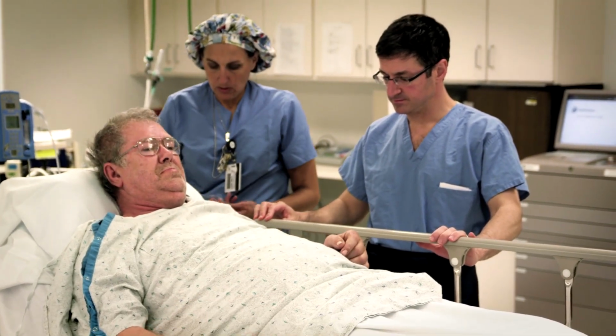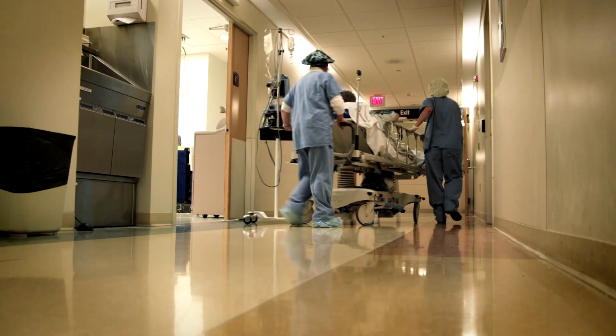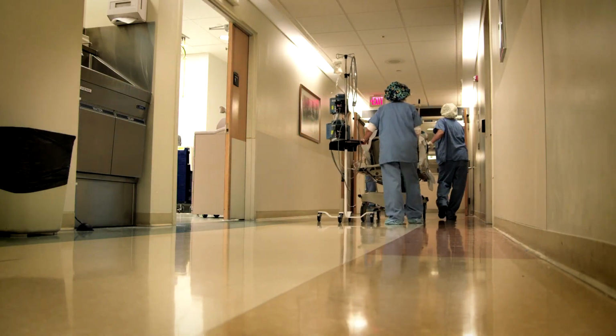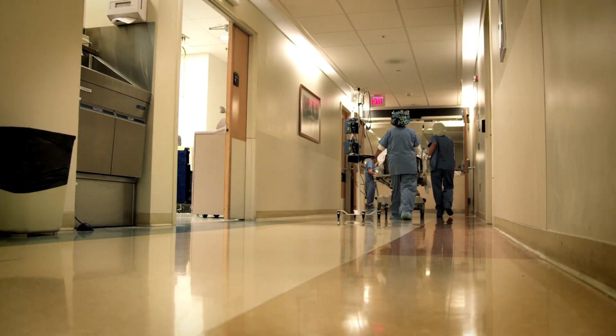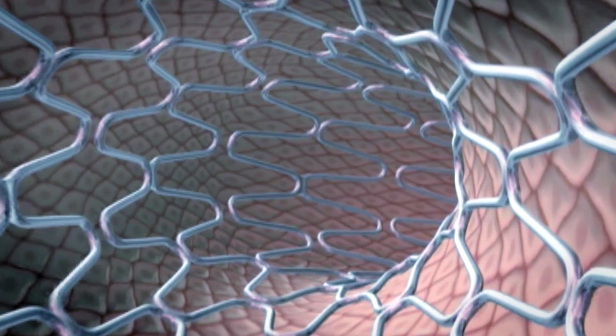The other major advantage is that because it's a small artery, and because it's relatively easy for us to gain control of afterwards, the risk of having a bleeding complication from a catheterization procedure is very, very low. It's really evolved. It's the same disease and the same problem, but it's evolved from a technology standpoint to really a much simpler thing for a patient to go through.